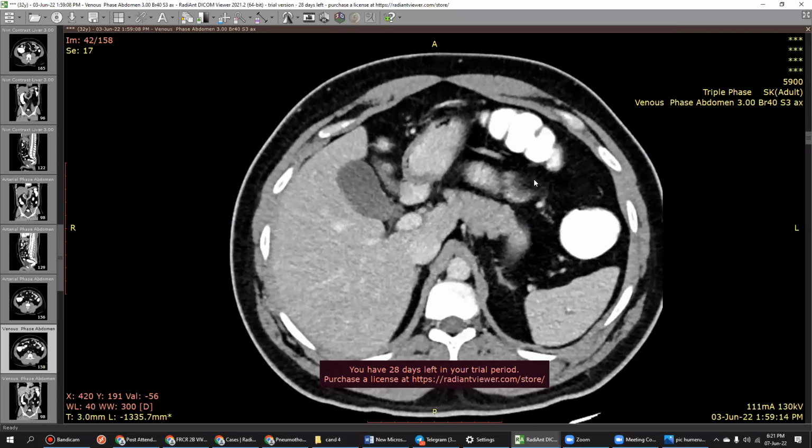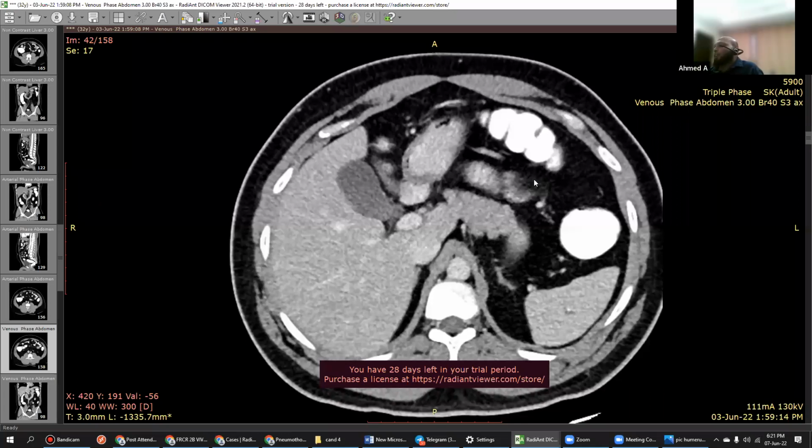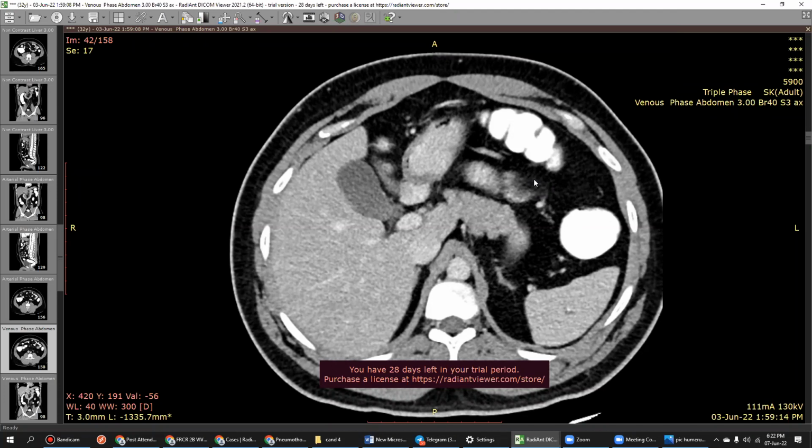I am just going to see the whole colon because I am feeling that the colon is not. No, you were telling about omental infarct. Why is it not an omental infarct? That's what I was asking. Because of the position, which is classical with presence of fat inside, also classical for epiploic appendicitis. Omental infarct is generally larger in size.